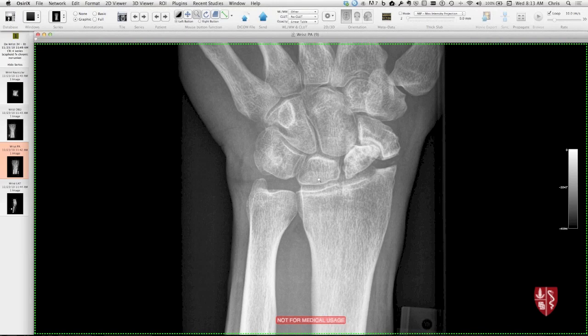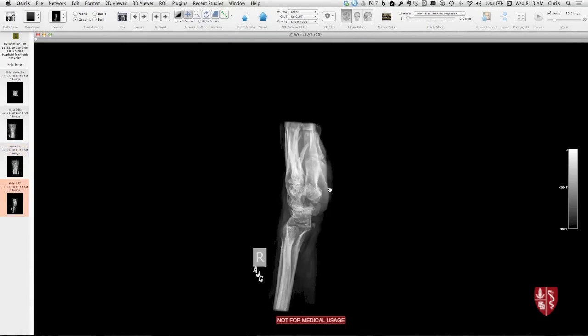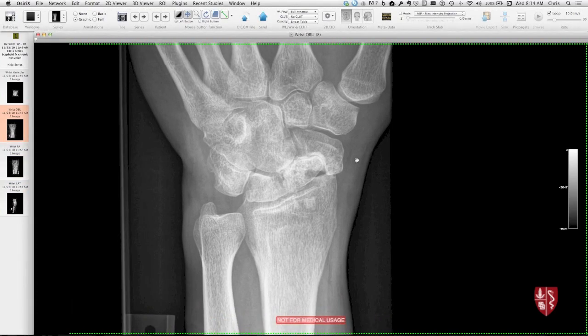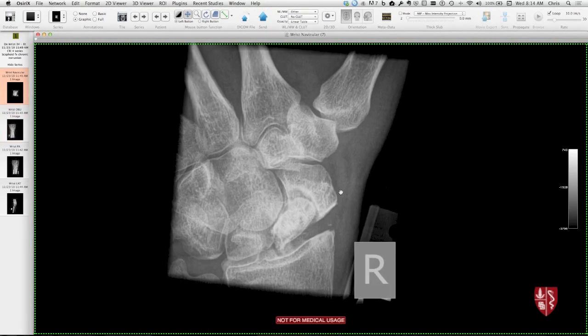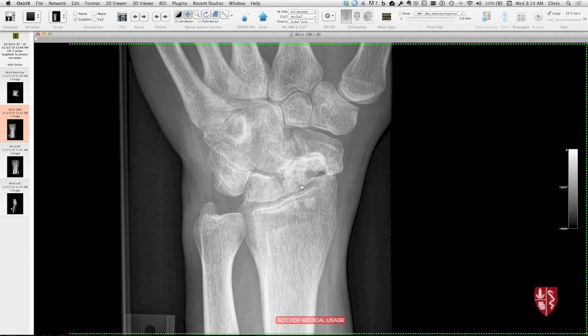Sometimes it's like a knucklehead patient that doesn't pay attention to their wrist and follow up. But so here's a scaphoid fracture that's like a chronic non-union with sclerosis of the proximal pole. The margins of the fracture are really irregular in here. And so this is a real problem for the patient because it's extremely difficult to get these to heal. You can't really get them to heal at all without doing surgery. And it leads to radiocarpal arthropathy. So you have malalignment. See the distal pole almost contacting the radius here. So that's that, and AVN leading to chronic wrist arthritis are the main complications, and high medical legal risk.